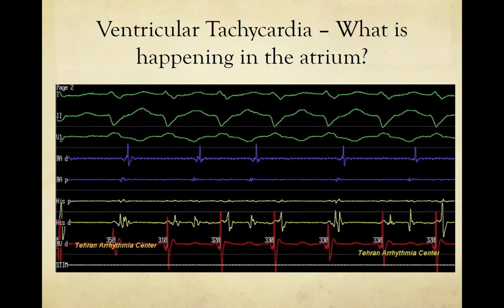So I don't know if this is a real possibility, but it looks like almost a Mobitz, like a retrograde Mobitz. Is that a phenomenon that could happen? If I might translate it, you're positing that the patient may be Wenckebaching retrograde. Is that correct? That's a much more eloquent way to put it. When you're 30 years out of fellowship, you'll say it much nicer than I did, I'm quite certain.